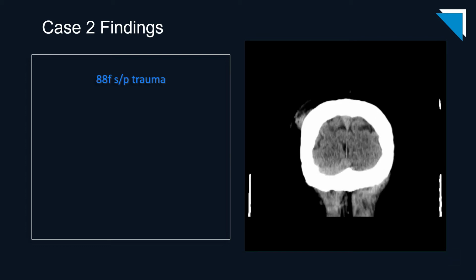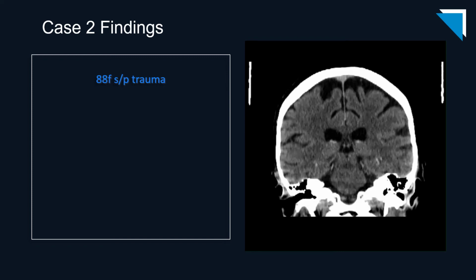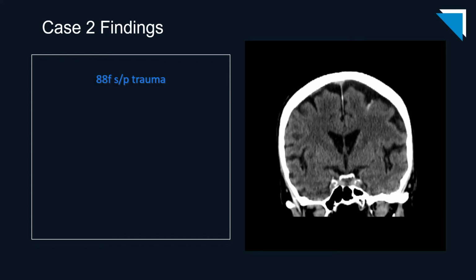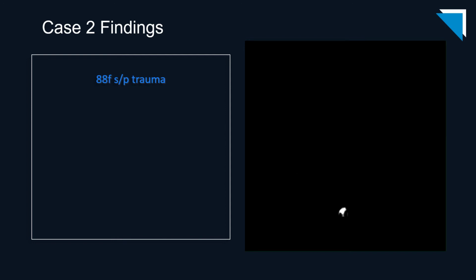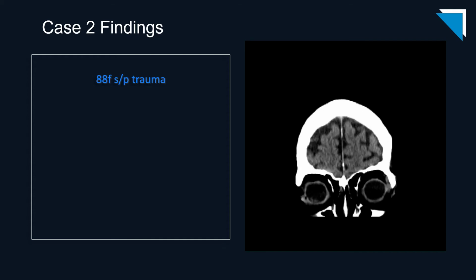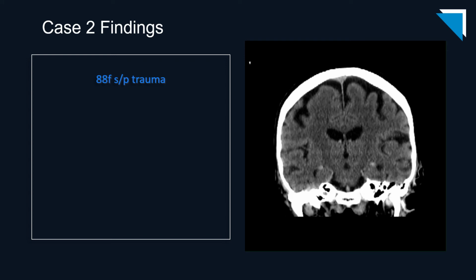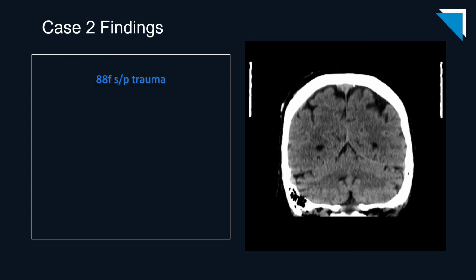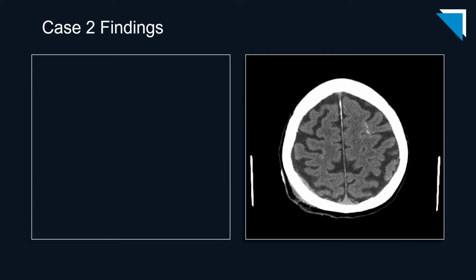It's very important to always review the reformatted images, particularly on head CTs in trauma cases. I always take a look at the tentorium here for subdural blood products. In this case, once again, those subarachnoid blood products at the left vertex are visible. As we discussed, there are subarachnoid blood products at the left anterior vertex.